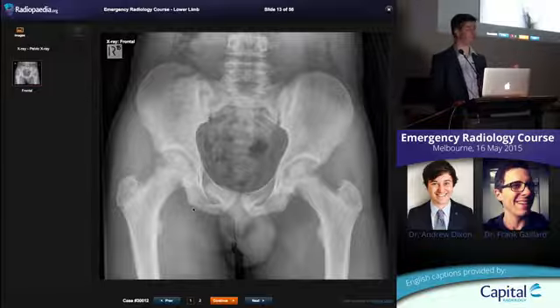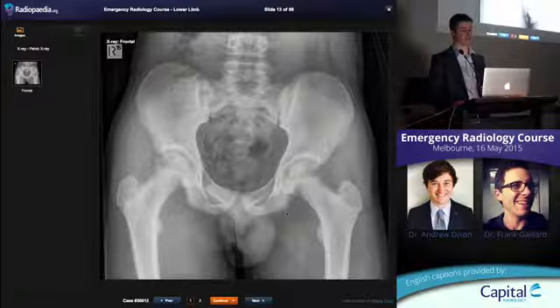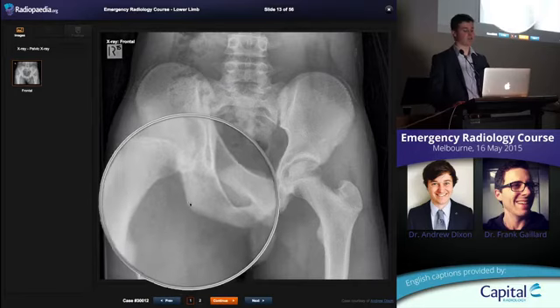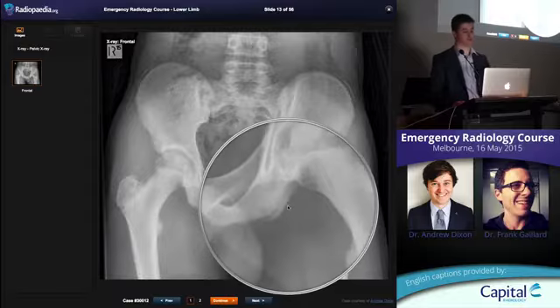The important thing is on a pelvic radiograph, you've got perfect symmetry, so you can always spot which side is different to the other. That's your go-to thing. So this one, can you see that very fine lucent line there? That's the cartilage associated with that apophysis as it's starting to ossify next to it. On this side, that's just separated away from the bone.